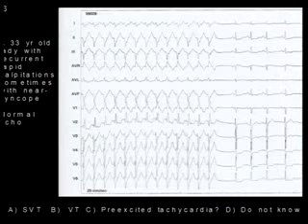This is a young patient with a normal heart. This sort of tachycardia is typically VT. The correct answer is ventricular tachycardia. Next slide. The reason why it's misdiagnosed as SVT is that it occurs in healthy young people, is by and large well tolerated, and responds to verapamil and diltiazem. So more often than not, even in the year 2013, this is diagnosed as SVT. But this is classically fascicular, left ventricular, idiopathic VT.